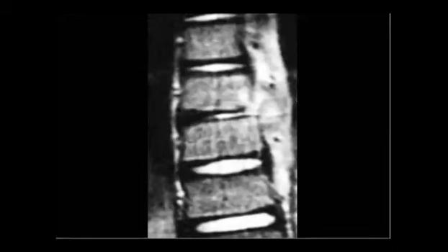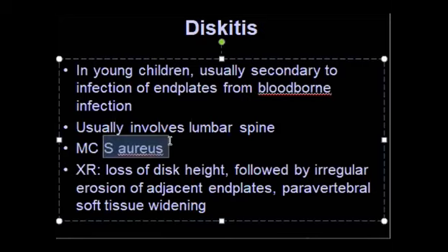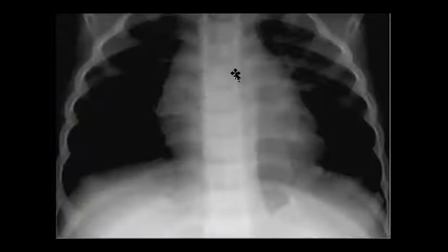Yeah, Shayma, Marwa, Ala. So the most important to mention in this top differential is discitis. It happens in the end plates, blood-borne infection, as you know, lumbar spine usually, staph aureus, they like it in MCQ. Disc height loss, and irregularity or erosion of the end plates. So this is your key. And as you see in the X-ray, there will be a paravertebral shadow.